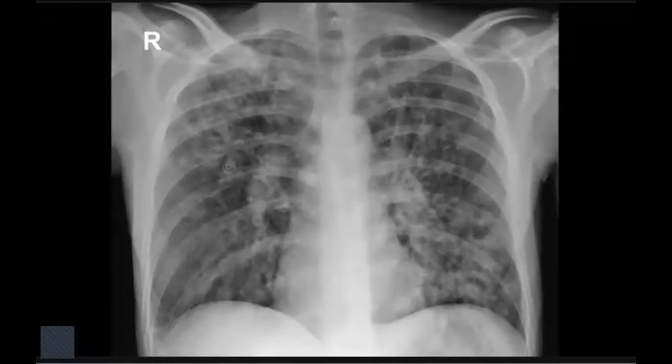These reticulations appear to involve more of both upper lungs. However, they also involve the left lower lung, more on the left than the right. They also appear slightly hyperdense, and more central rather than peripheral. I really couldn't appreciate decreased lung volume in either lung. However, there is fine blunting of the right costophrenic angle, which may be a very tiny pleural effusion.